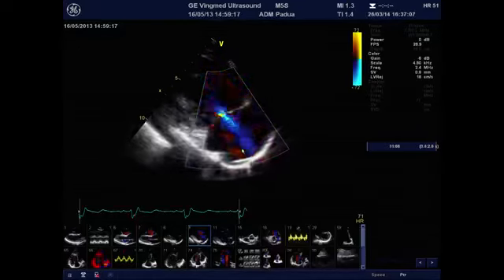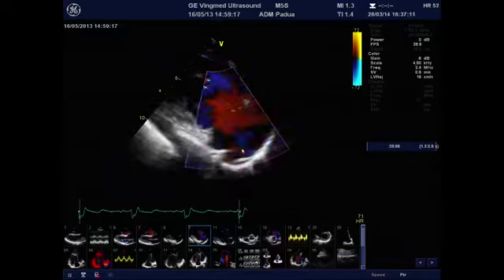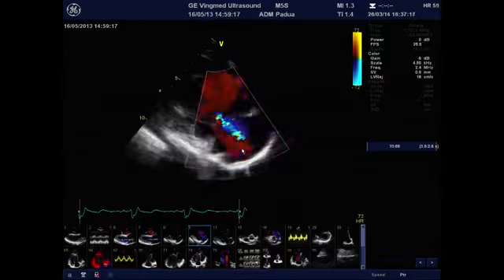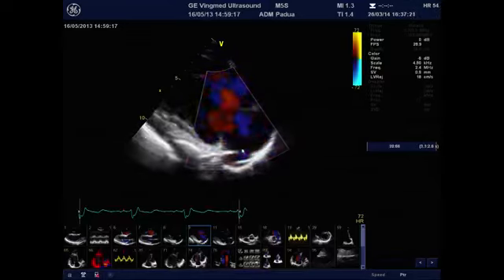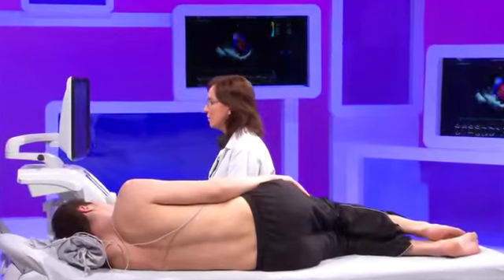This is an important aspect for the quantitative analysis, because these variations with respiration are very frequent and may confound your measurements. So please be sure that when you acquire several cycles, you do a mean, the average of several measurements on at least 3 cycles in a sinus rhythm, and before acquiring, you need to ask the patient to stop breathing.